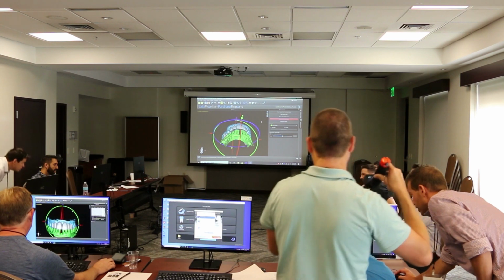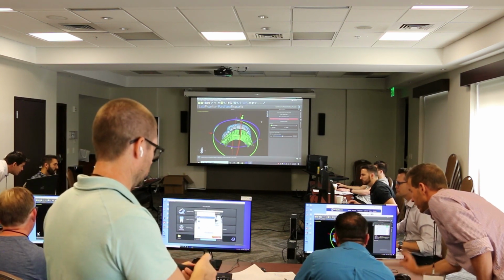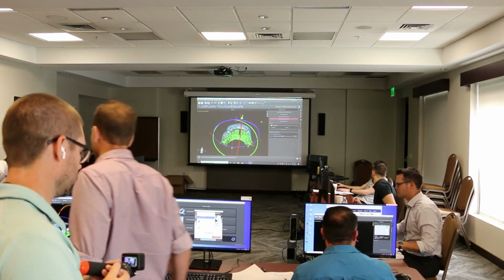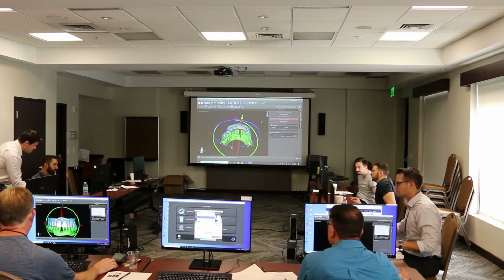All right. Okay, so you get the idea, right? Maybe scoot back just a touch there, right? You're pretty close there. So you got things globally close. So I'm going to help you with the next step here in a second. Hey guys, Dr. B is here, and he's going to help walk around and help teach.